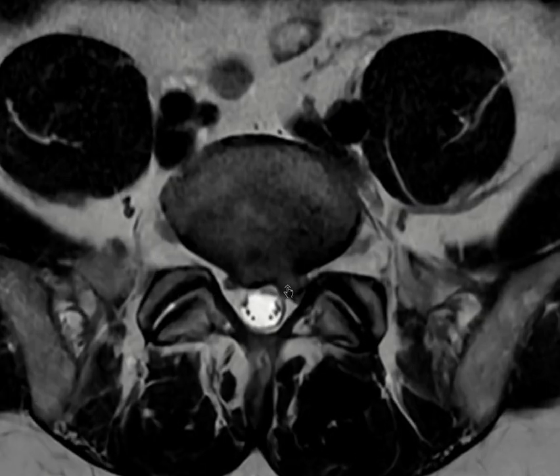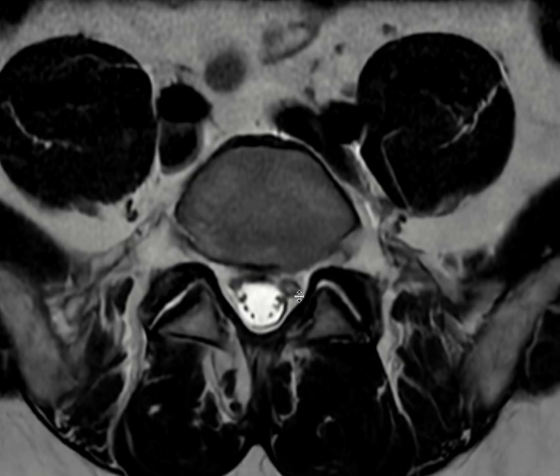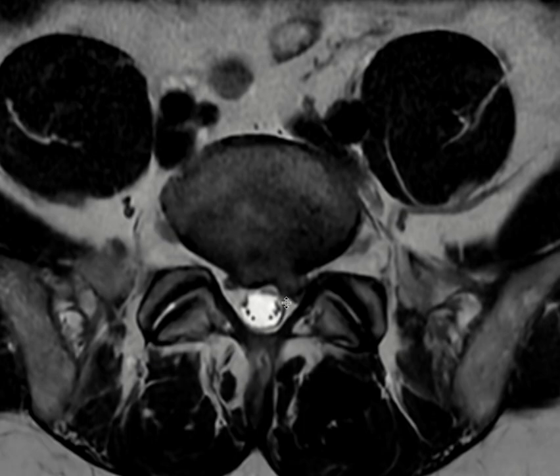So when we want to discuss this, or we want to dictate, you're just going to say there is a central disc protrusion with some sort of left paracentral extruded fragment that is just projecting here into the thecal sac. As you see, it's just touching the ligamentum flavum and facet joint, and here, right there, this is the S1 nerve root that is just getting compressed by this extrusion. So this protrusion with extruded fragment is causing mass effect on the left S1 right there, and also somewhat it's just touching the right S1 here.